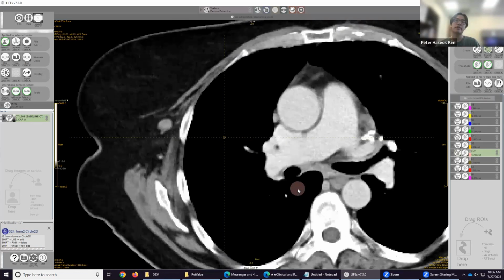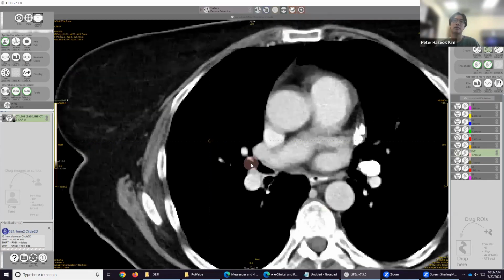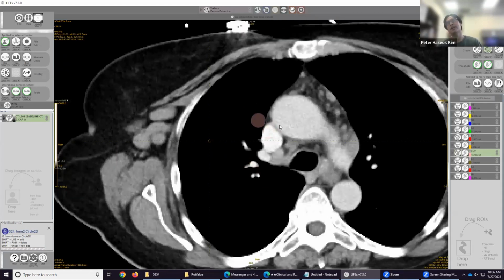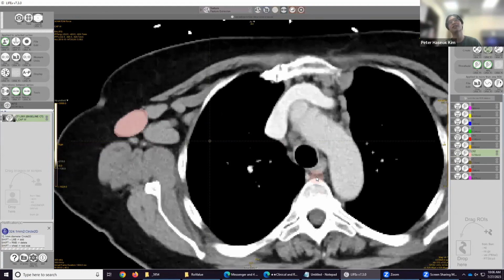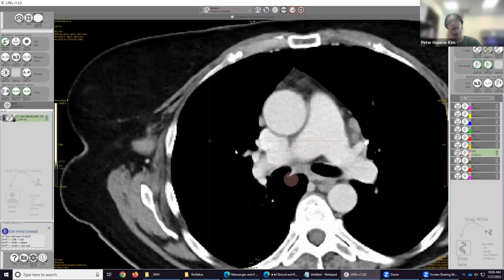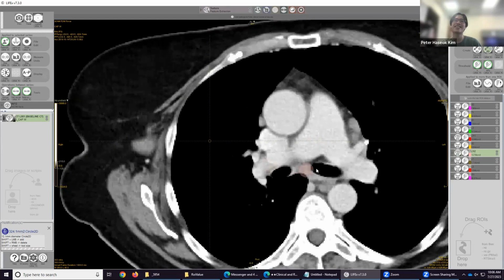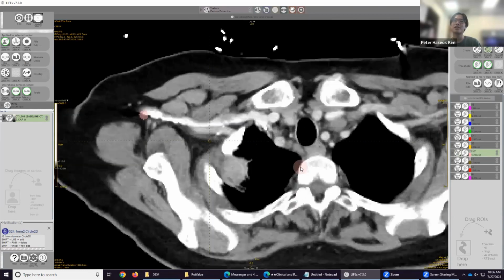Yeah, so there's a lot of confusion, especially when we approach things like the hilum, like right hilar, left hilar region. Also, you're going to find on the radiology reports that they're pretty vague, and sometimes the relative location can be very arbitrary. For example, if they say paratracheal, sometimes we found lesions as far down into the hilar, like this part where it's adjacent to the bronchus or something. And so I think relative location should be emphasized.